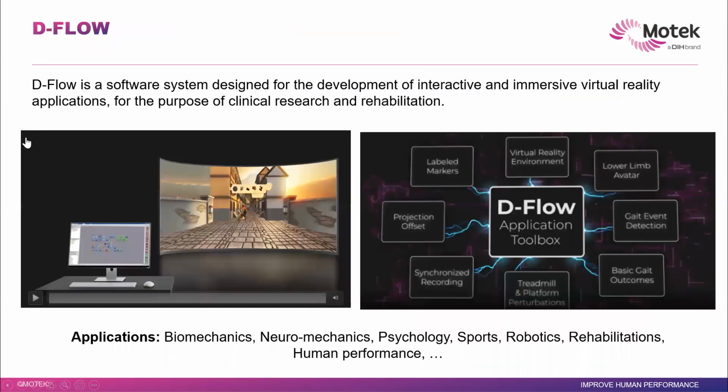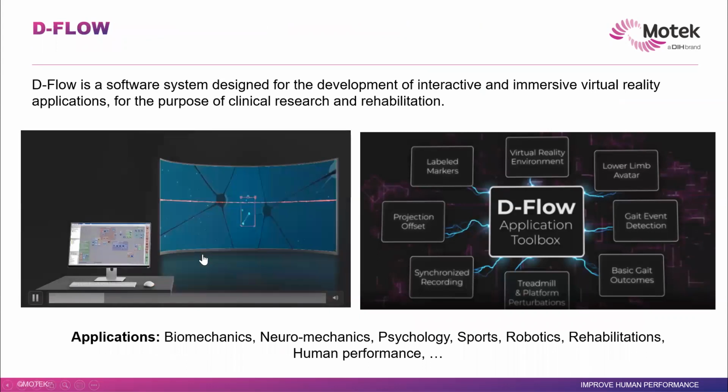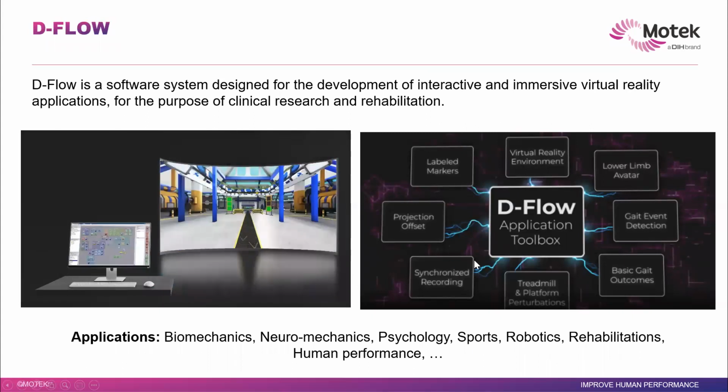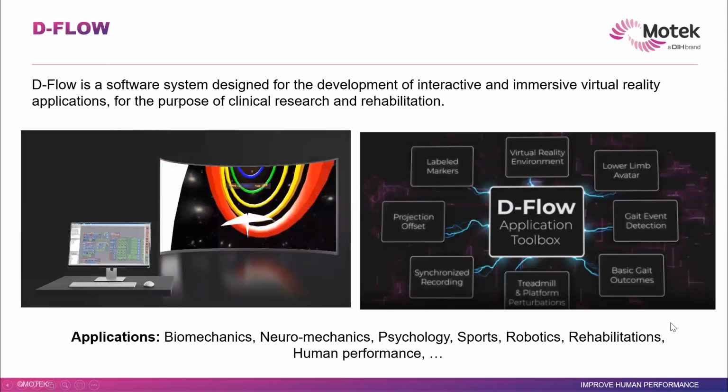D-Flow is a software system for real-time interactive immersive virtual reality applications, more specifically for clinical purposes or rehabilitation, but not just these applications. Our users use them for quite different applications. Here, for instance, you see a game being developed by Motek. And here are some of the features of D-Flow software, which can be used in biomechanics, neuro-mechanics, psychology, and so on.